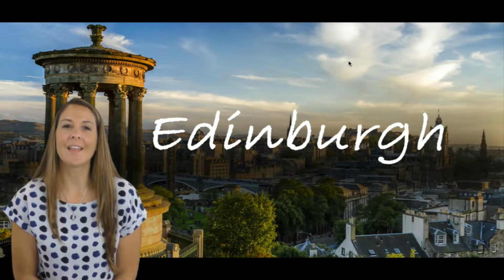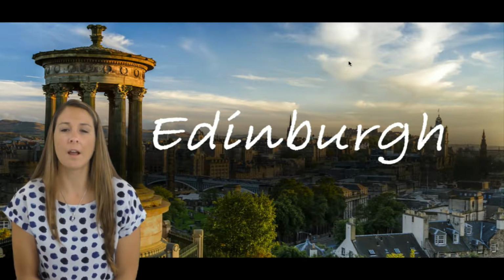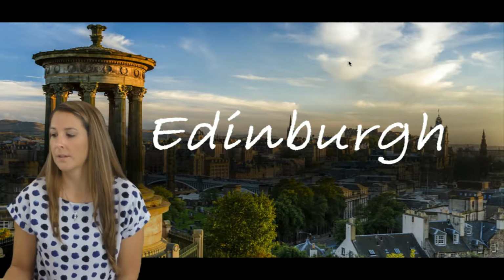I'm Kara Negri, and in this video we are going to be going over the entire Edinburgh Visual Gait Score. This is the most requested topic because the Edinburgh Visual Gait Score is a quite thorough score that you can conduct on gait analysis in order to provide an outcome measure. So this video is assuming that you've already taken your videos in the coronal and sagittal planes, and we're going to be using the web-based software to analyze the videos.